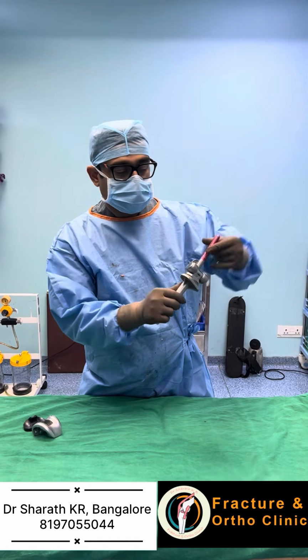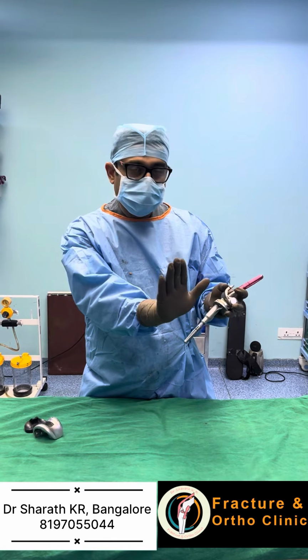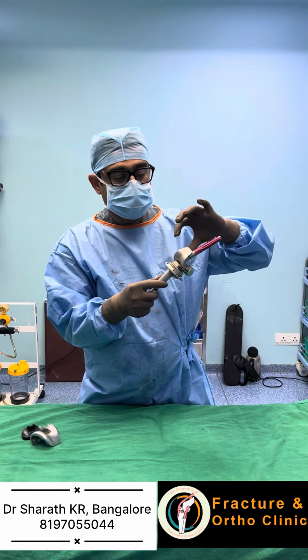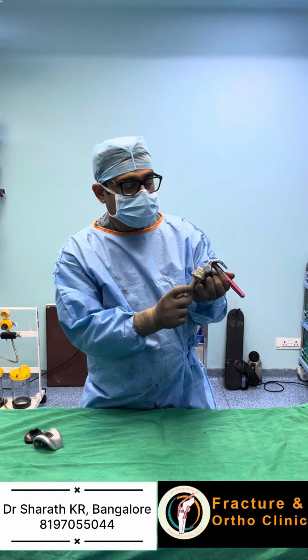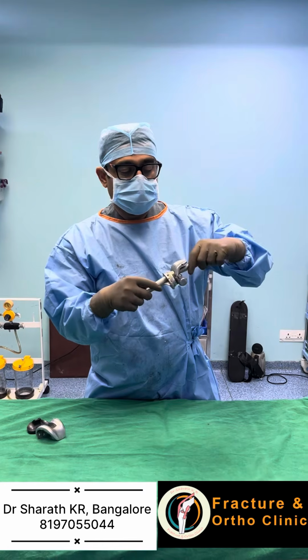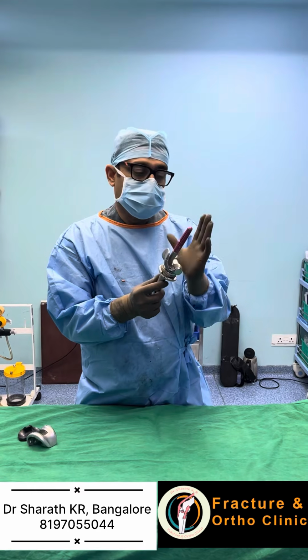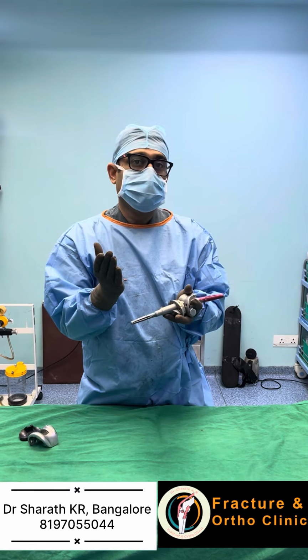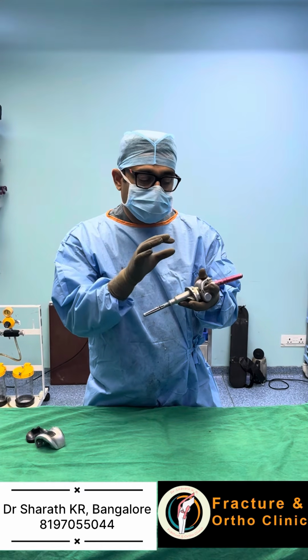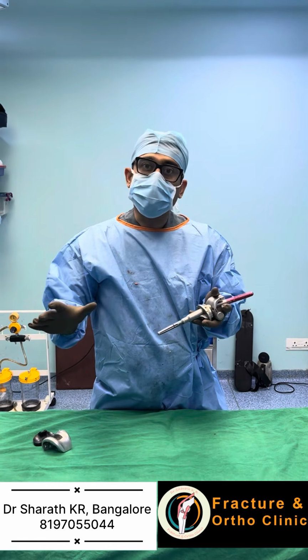There is a stop. There is no extension. Means hyperextension. This leg cannot be extended after some range of movement. That is going to be stopped by the hinge. So hinge will control the movements and it will stop the knee after some range of movement. Person cannot extend further. That is called hyperextension stop. This is a specific function which is seen in hinge knee replacement than any of the other type of knee replacement.